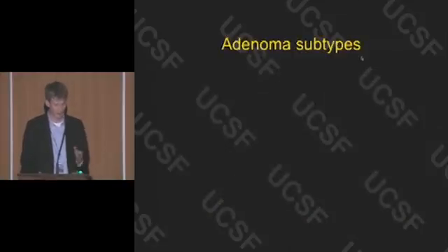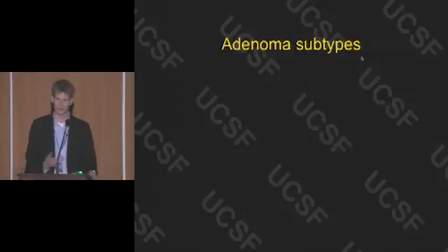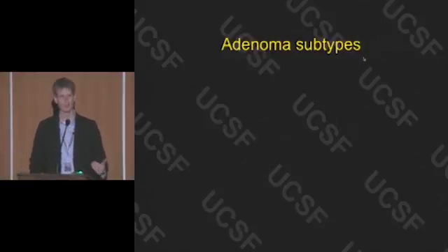So I think with adenomas, one thing that really confused me when I was in training was there's a very varied appearance of adenomas, like I just described. And one way to keep track of this is to remember that adenomas have recently been broken down into subtypes. And when you think about the subtypes, it helps me interpret these images.